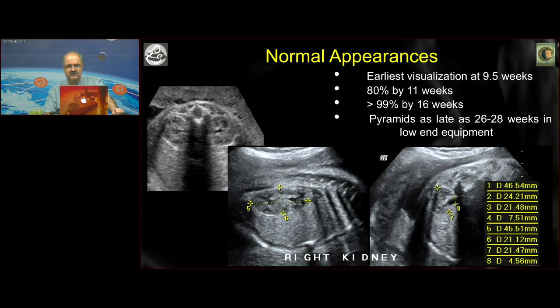The overall measurement of kidney size is done more as a matter of routine for comparison later on in case you find an abnormality. When you have a doubt on whether a kidney is hypoplastic or not, or in case you see an abnormal kidney such as an echogenic kidney, the differential diagnosis of a small echogenic kidney is quite different from that of a large echogenic kidney.